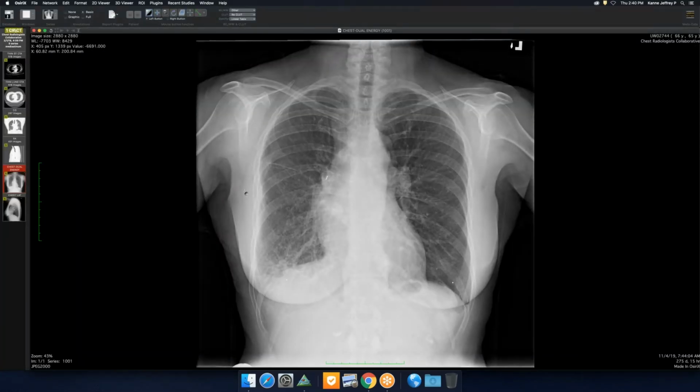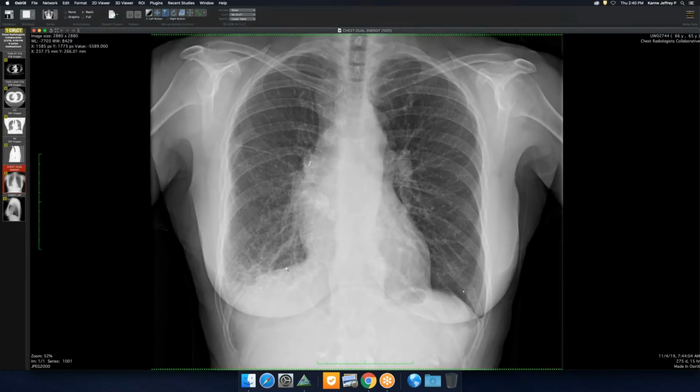So now you have. This is a pretty classic case of an abnormal chest radiograph with what looks like fibrosis in the right lung, but you'll see a couple of things. First of all, there's either pleural effusion or thickening. There's a clip here at the hilum, and then there's some dense calcium around the hilum. And the right lung is small, and there's some upper lobe volume loss.